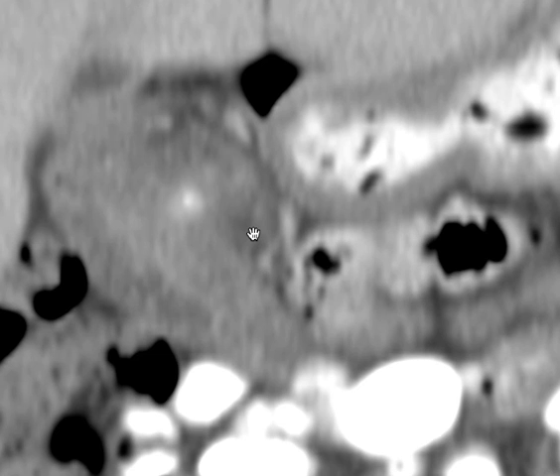And the other thing you want to look for is an abscess. So here it's inflamed, you have a collection of contrast, but you don't really see a defined fluid collection with a wall that would be an abscess. And that can be difficult. That's why we give oral contrast on CT, because this loop of small bowel, if it didn't have oral contrast in it, could look very much like an abscess. It can have fluid and debris and little pockets of air.